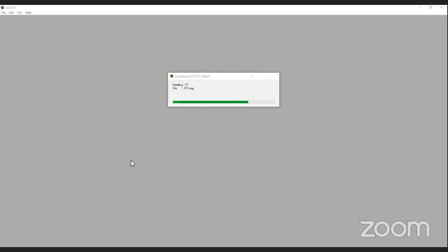You have something in those XYZ options, the MU backscatter factor or something like this. Default is 102. What does that have to do with the output? Or if you generate your output table, then you don't need this value. Well, that's a good question.